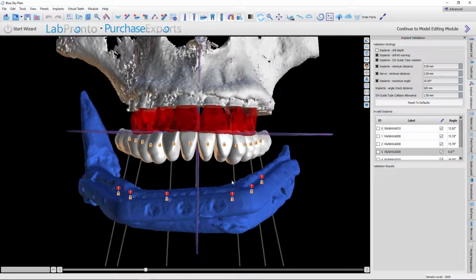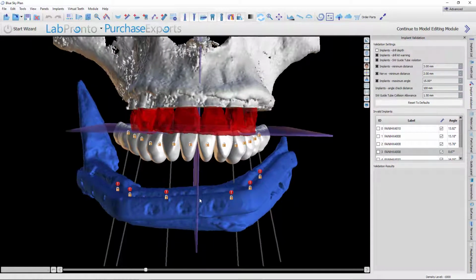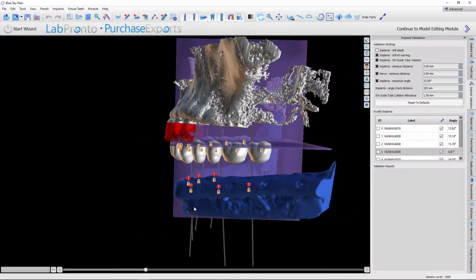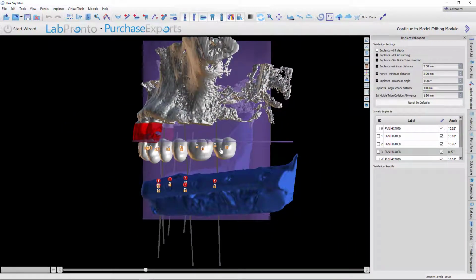I have to set a full arch of lower teeth, and I have to set it against a maxilla which only has some anterior teeth present. And so I don't want these posterior teeth to be way low or way high, so that when Danny Doming, who's doing the surgery and restorative here, goes and makes the upper teeth, I want it to actually be in the proper position.